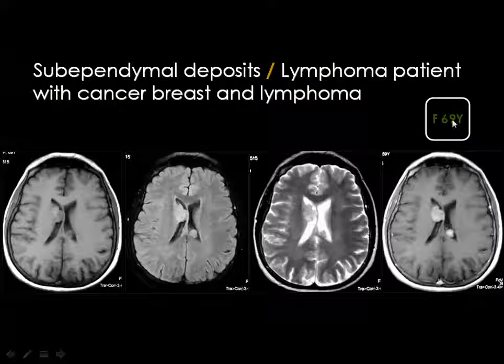Then you look at this case with this female patient is known to have breast cancer. Then in the T1 weighted image, you can see nodules in the wall of the ventricle, and these nodules have shown homogeneous enhancement. This patient had double primary. It has breast cancer and is known also to have lymphoma.